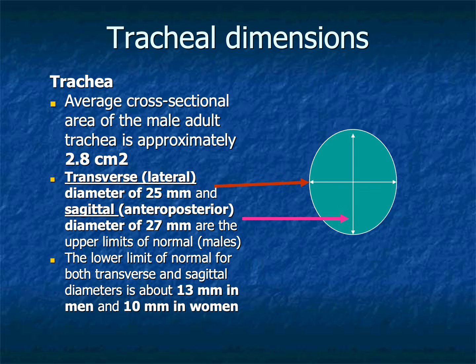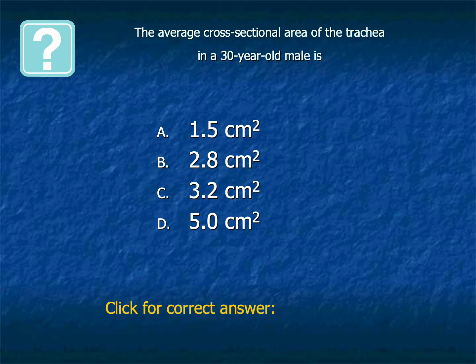This educational review reinforces the approximate cross-sectional dimensions of the adult trachea. Measurements matter in bronchoscopy. A few millimeters of narrowing may dramatically alter airflow resistance, especially during exertion or respiratory distress. The bronchoscopist gradually learns to estimate airway caliber visually, while also understanding the limitations of visual estimation alone. Precision matters because interventions, stent selection, dilation strategies, and procedural planning often depend upon accurate anatomical assessments.